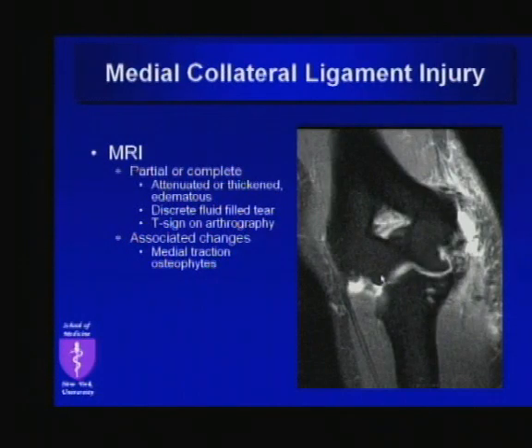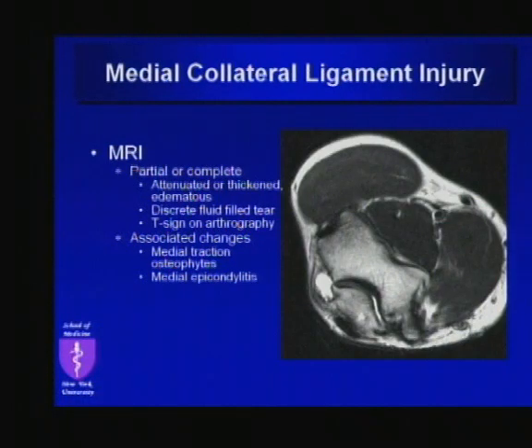This particular pitcher came in with acute exacerbation of pain, and he had associated severe medial epicondylitis with partial tearing of the common flexor origin here. So now he's showing us at least two associated signs. This is a beautiful illustration here, I think, of what I was telling you about before, that posterior medial impingement.